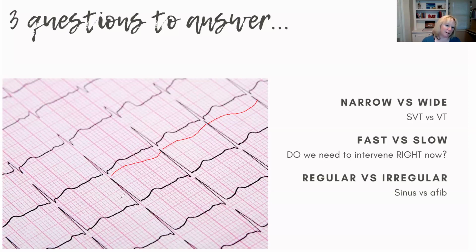And while we're here, this is our P, right? We're always looking for the P. And this is our QRS, not too wide, which is good, okay? And we should have, on every complex, a P. So let me grab my heart tool.